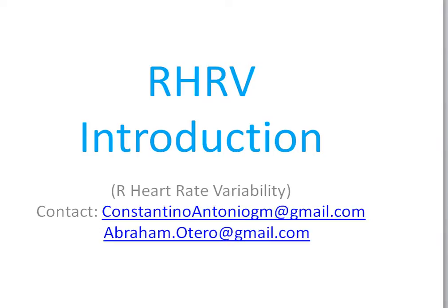This video tutorial covers only the basic functionality of the package. For a complete reference for its functionality or more advanced functions, check the documentation in the RHRV website.